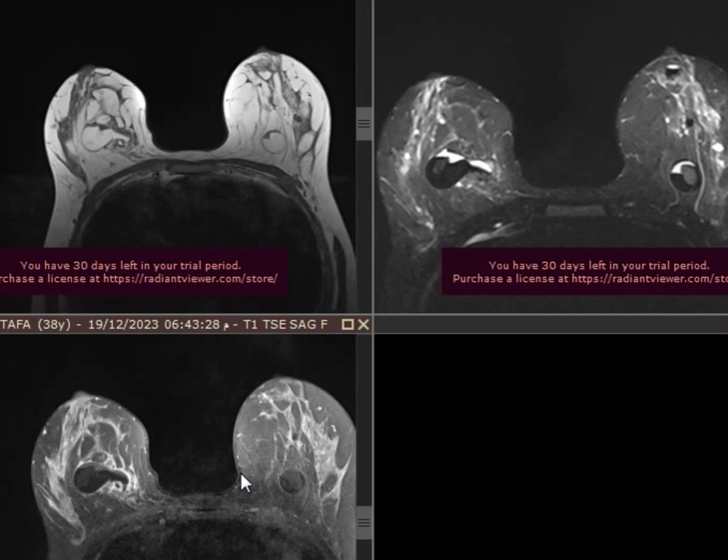Bilateral fat fluid level. It's a very high possibility of oil cysts, and these were bilateral large oil cysts. The question here, which was, in my opinion, the main point for this case: oil cysts are usually small. These are big oil cysts, and that's what makes them worthy of presenting the case.